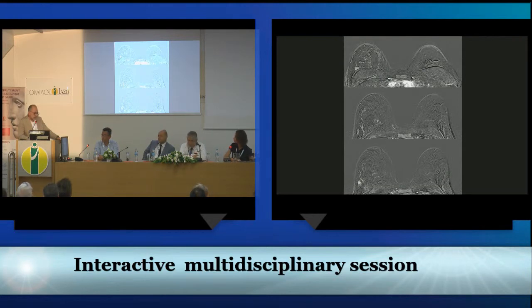I would go for assessment with a second look ultrasound probably. Yeah, so she had multiple lesions. So if you have multiple lesions, do you do biopsy of all of them or some of them? Because of the heterogeneity of the breast, do you prefer to do only the big one, or do you prefer two different types of lesions? Do you do two, three, or four biopsies?